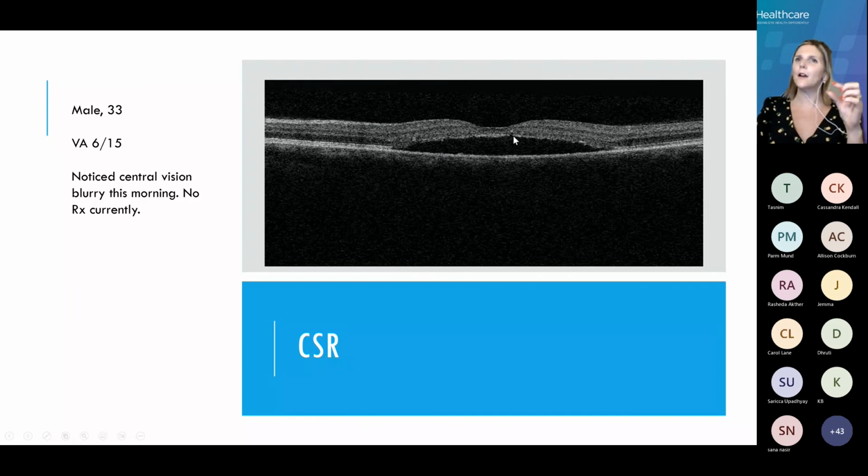Sometimes we get chronic CSR where you may get more dangly bits where it's starting to try and stick back together, but it doesn't, so it's recurrent. You can sometimes see that quite clearly. So this is a CSR case though, so well done.